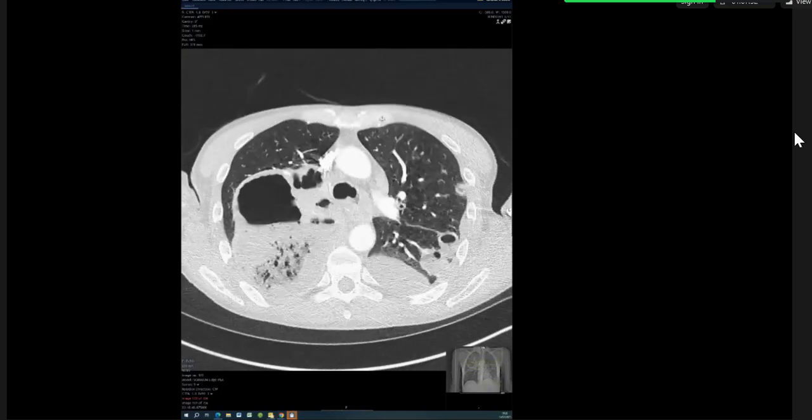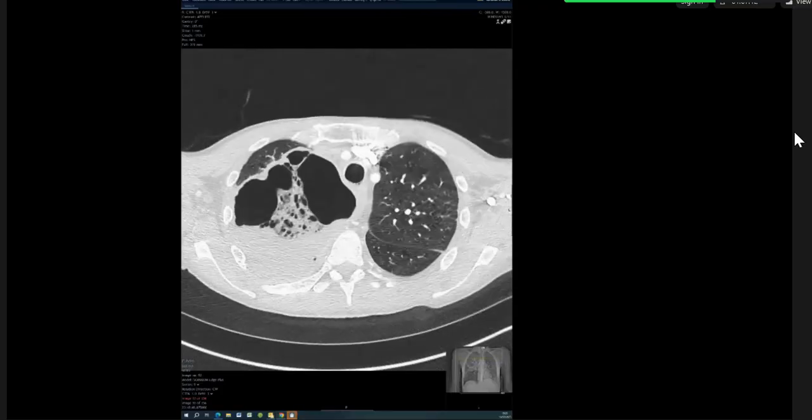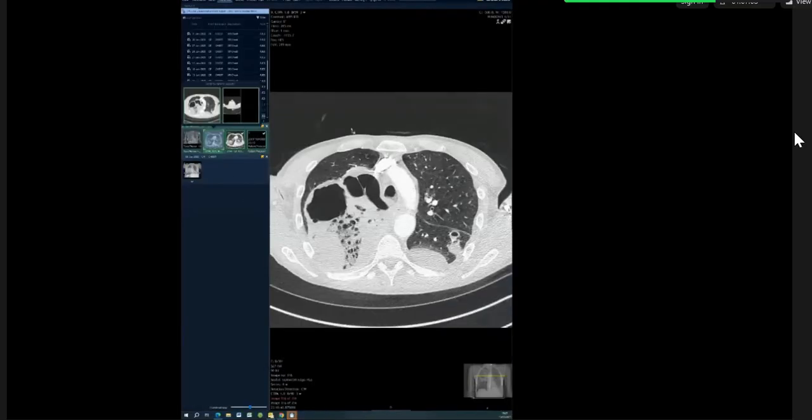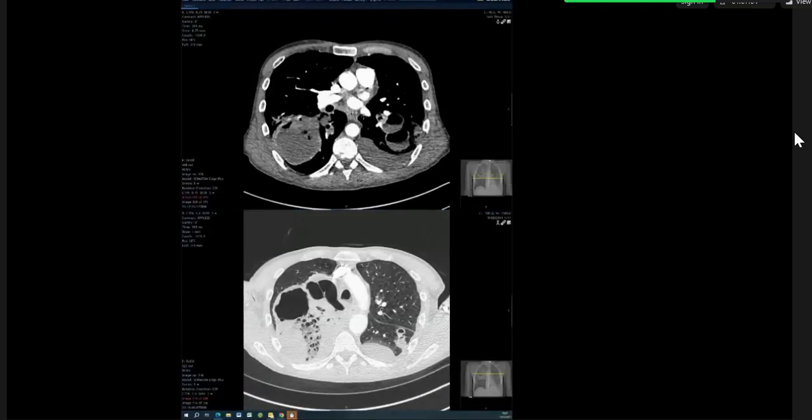However, the typical course of granulomatosis doesn't go aggressive like this. The lesion in the right lung is so large, so my differential diagnosis includes multiple abscesses, multiple septic emboli. Maybe the patient has a history, but not typical of TB, because fluid levels are seen in many other regions.